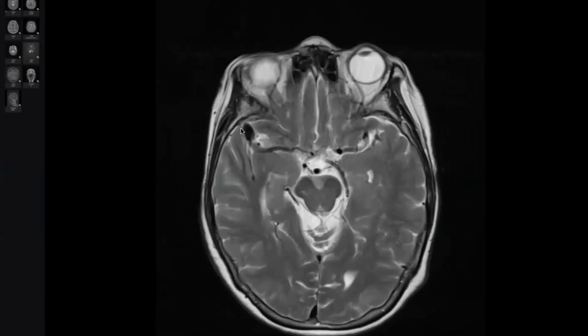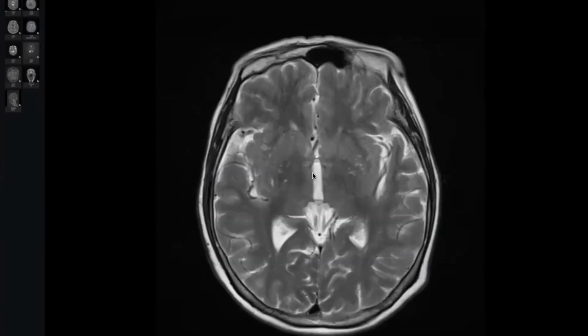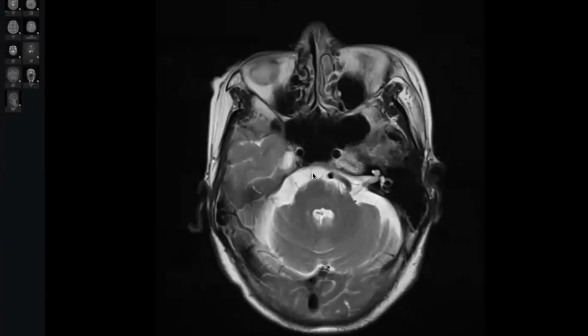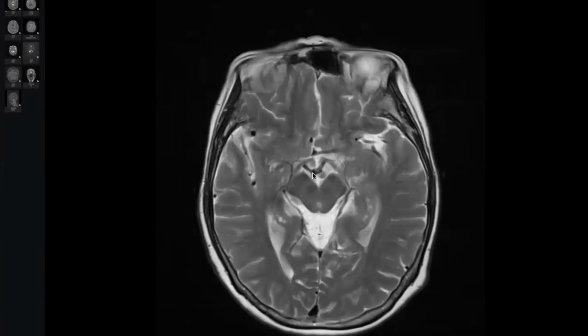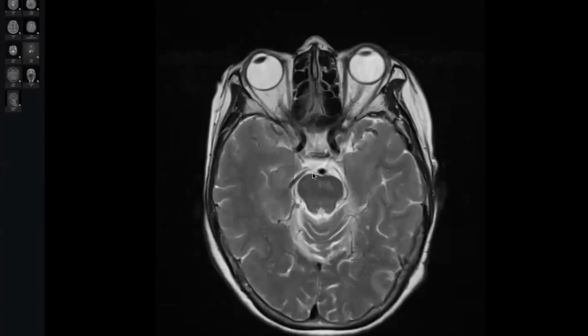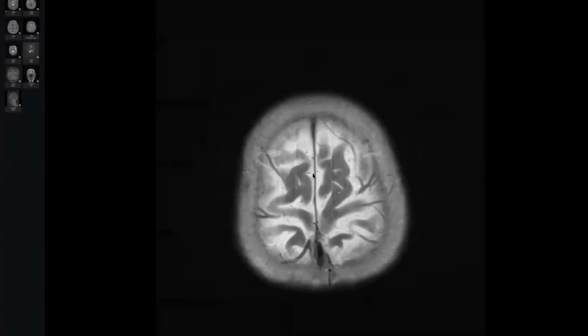Oh, okay, doctor. There is focal dilatation here. And you didn't tell me, doctor, that the rest of the vessels are normal, because aneurysm may be multiple. This is very important. So my eye in the second round is at the review areas. One of the review areas is the last cut.